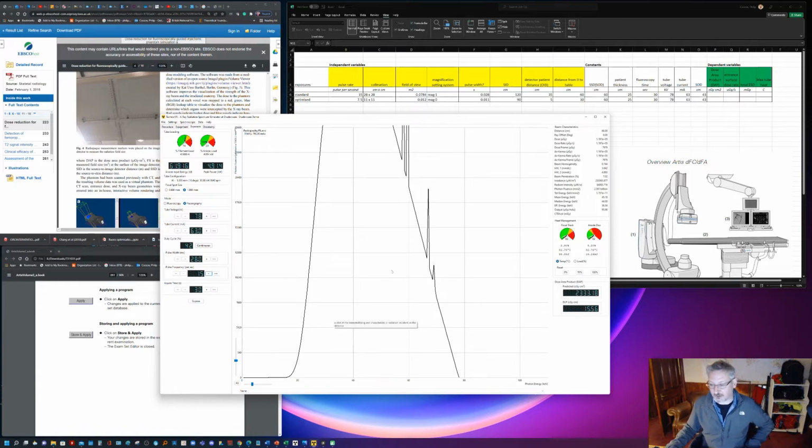What this graph is showing you is the actual dose for the whole exposure, for the whole 30 seconds. So as you can see, the things that we've been doing have been increasing it. So it's gone off the scale there. We'll bring it back in a minute. So we've got that set, we've got that set. Field of view we don't use. MAG1, that's included in this pulse width which we've set.